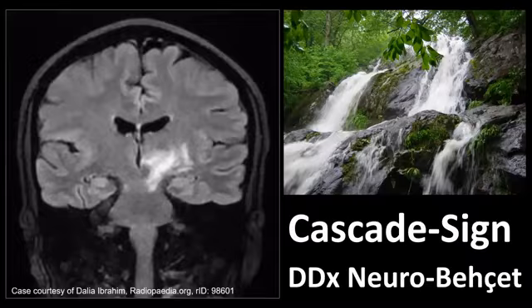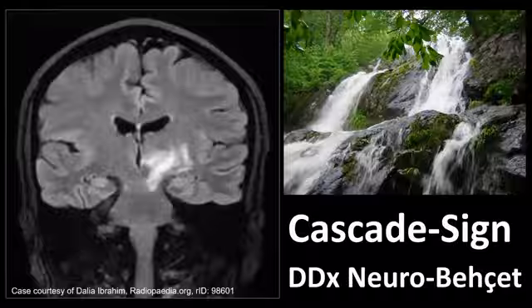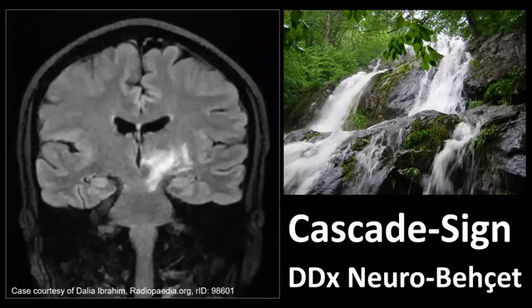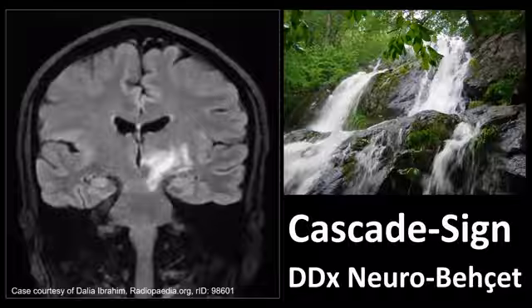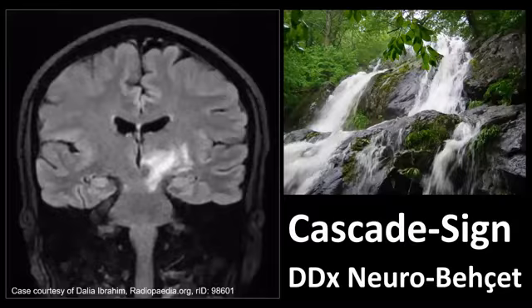Neuro-Behçet is a rare inflammatory disorder, at least in my part of the world. It's definitely more prevalent in, for instance, Turkey, the Middle East, and China, so countries along the old Silk Road. That's because there's a genetic component involved. Anyways, if you see this pattern, consider the possibility, because otherwise maybe nobody will think about it.